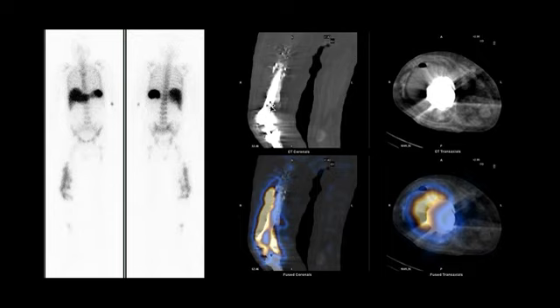And the SPECT CT showed that they have a prosthesis, a femoral prosthesis that continues as a knee prosthesis. There is abnormal fluid density in the anterolateral aspect of the prosthesis, which is where there is abnormal accumulation of white blood cells. There is also an air fluid level here, and these findings are consistent with abscess formation in this region. So prosthesis related infection and abscess formation in the right knee.